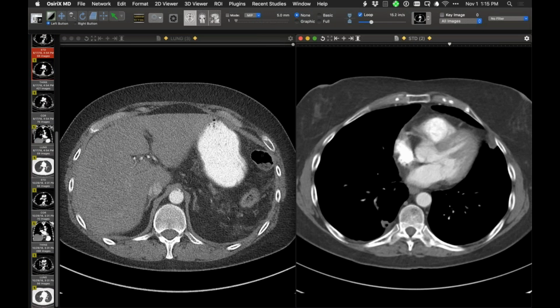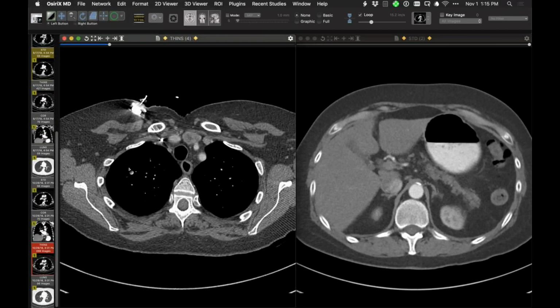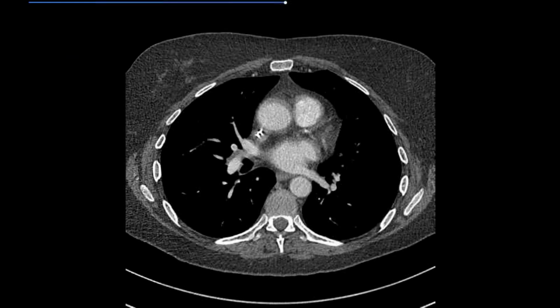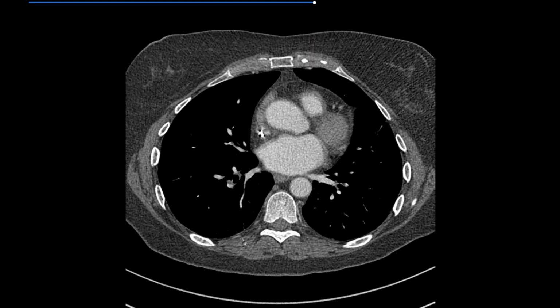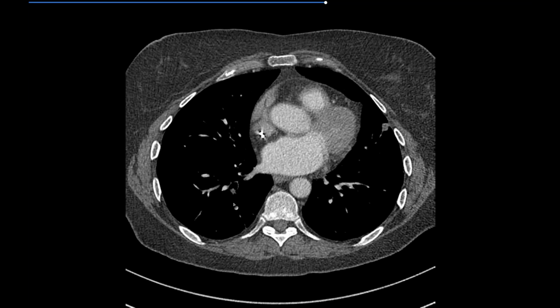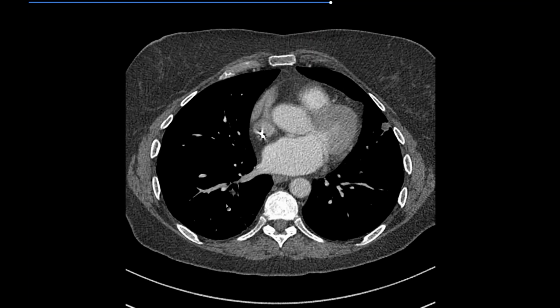And I'm just going to show you, out of interest, a follow-up exam showing you that small vessel that I showed you. It basically stays occluded. It never recanalized. There's never fibrinolysis. So watch from this point. It disappears right there. And right now it's a very tiny thing, but this is a vessel that never recanalized.